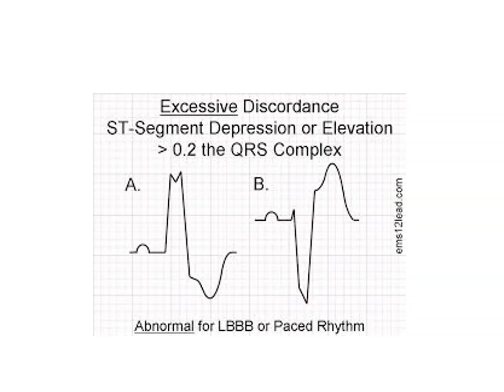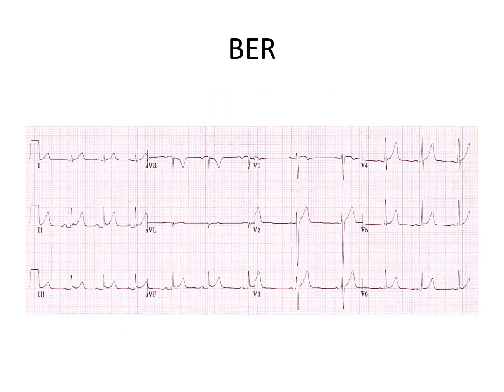And again, ST segment depression or elevation higher than 20% of the preceding QRS complex. Moving on to benign early repolarization. It's most prominent in young, fit, healthy people and at low heart rates. And the things that define it are minimal ST elevations, mostly in leads V2 to V5 with a concave morphology. So morphology you can draw a smiley face on.